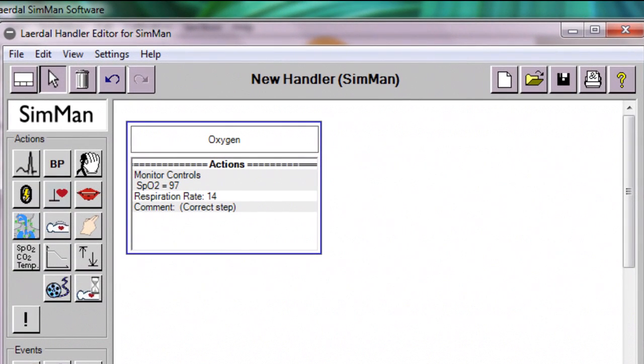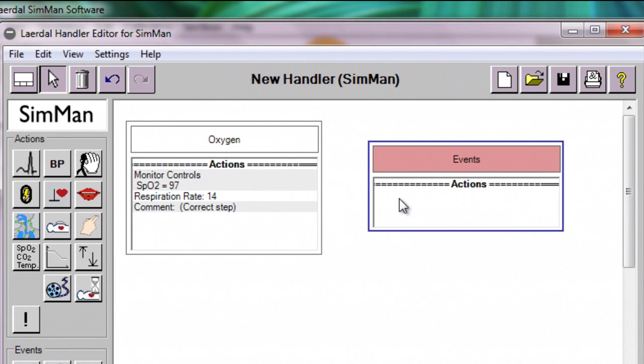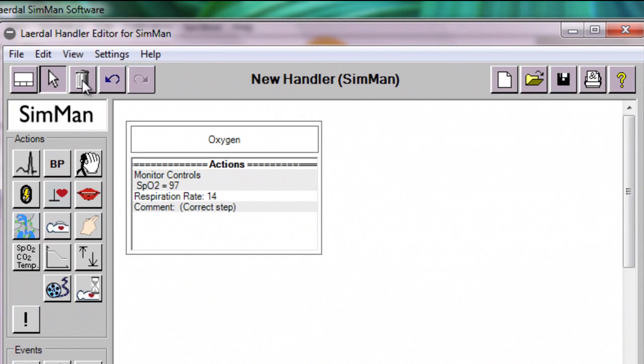Now, if I wanted to, I could add more boxes by clicking the Create Frames button and anywhere in our blank field, and this creates a new frame. I can also delete unwanted frames. The first thing I need to do is make sure my unwanted frame is highlighted, and I can tell that it is by the blue highlight. And then I'll move up to the trash can, which is the Delete Object button. I can click there, or I can press the Delete key on my keyboard.